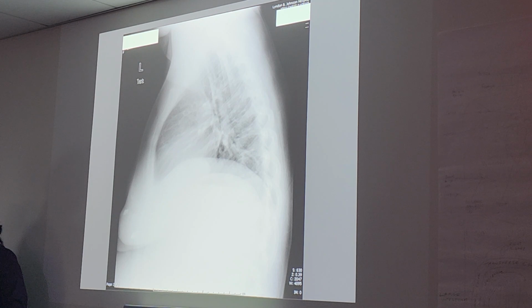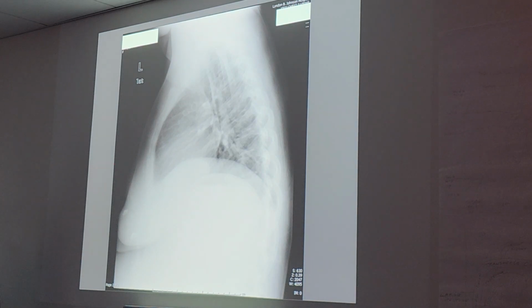Centering is off. Tell me why you think that. Looks like it's too far down. Too much at the top. Centering looks really close to lower than T7. It looks like it's too far down. And what about the MCP? It's not centered properly. The CP is too far back. Looks like they centered too anterior, right? Yep. Okay.